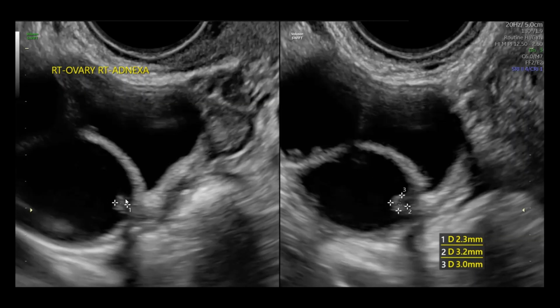This is the other area. We're going to call it a solid area for now until we evaluate those measures on the bottom right. The other solid area that we did see at the second glance in the cine loop. And in this scenario, we have measurements, again, in 3 orthogonal planes. What we're appreciating here is the width. Arguably, that's also measuring the distance from the edge to the outer aspect, and similar here. Number 1 and 2, both of those are actually different.